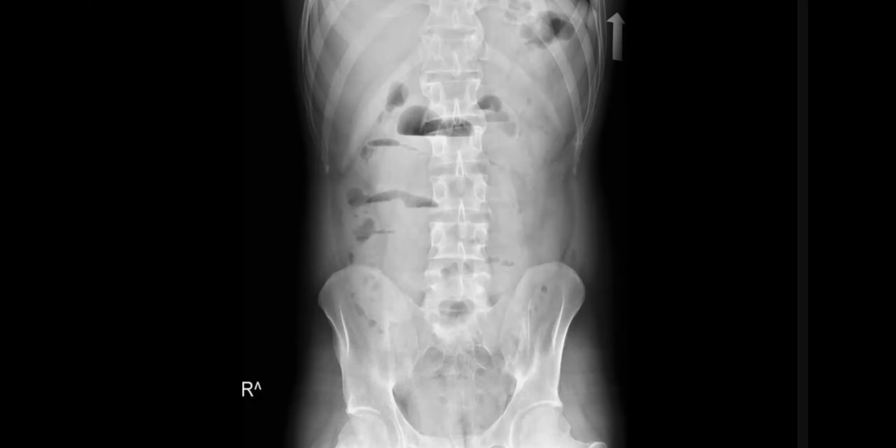Okay, so possible causes can be detected from the radiograph, like surgical clips, like radio opaque shadow, many causes can be detected in radiograph. You should mention what are the causes of small bowel obstruction, my friend? Yeah, the most common cause is adhesive bands that can follow any post surgery. So I should be looking for clips. Good. What else? Also, gallstone ileus. I'll look for pneumobilia and the gallstone. However, I cannot really appreciate any pneumobilia.